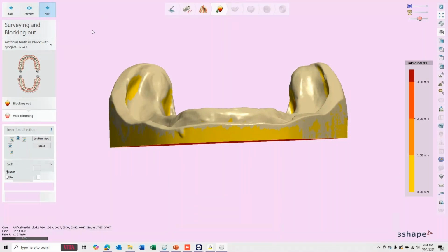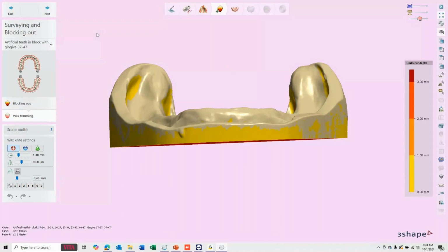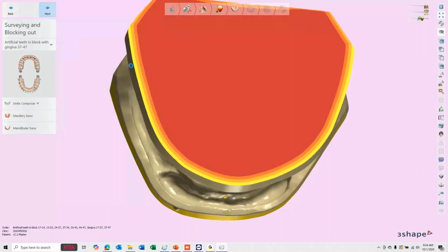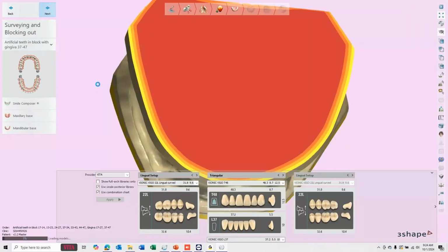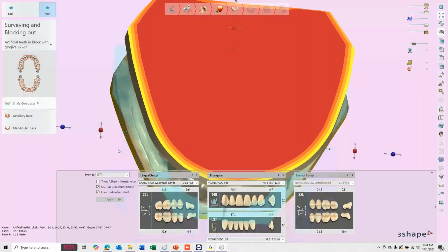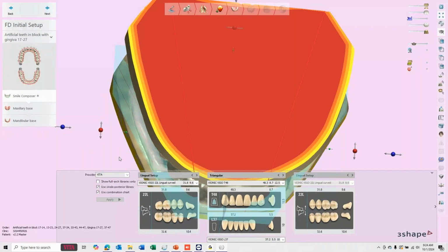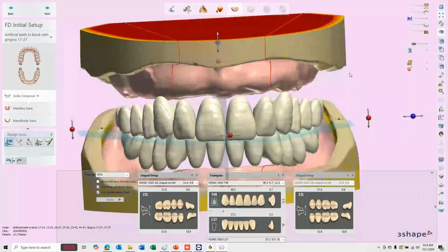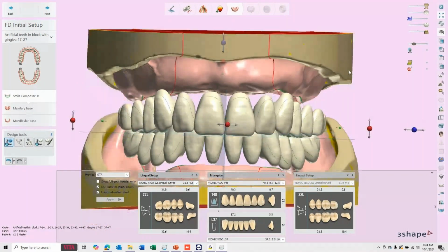I've got a lot to show you guys today. So I'm kind of moving through this a little quickly, but again, it's recorded, so if you guys want to go back and watch it again, you can. All right, we'll let it quit thinking here. And there we go. So this is our tooth selection part of this.